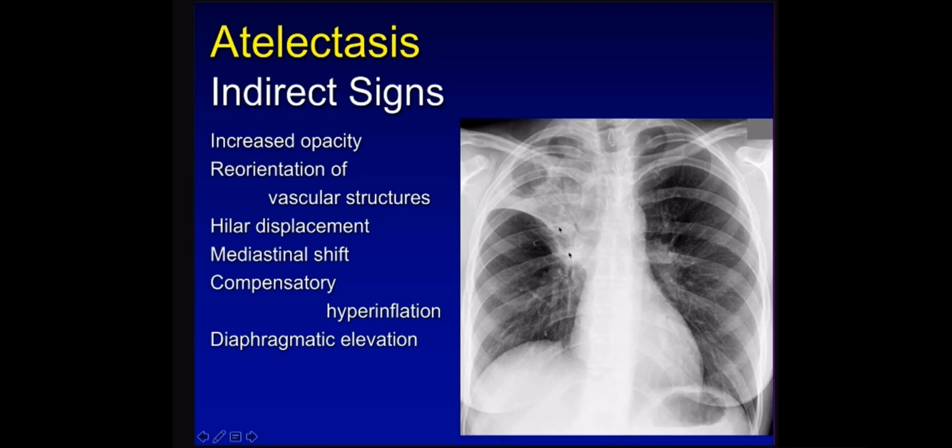This patient has a central obstructing tumor, giving us the so-called S sign of Golden, where we have these interfaces. This is the minor fissure that's displaced upward, giving you part of the S, and then a right hilar mass giving you the other part of the S. And notice the right upper lobe is atelectatic. It's got increased density, as you see here.